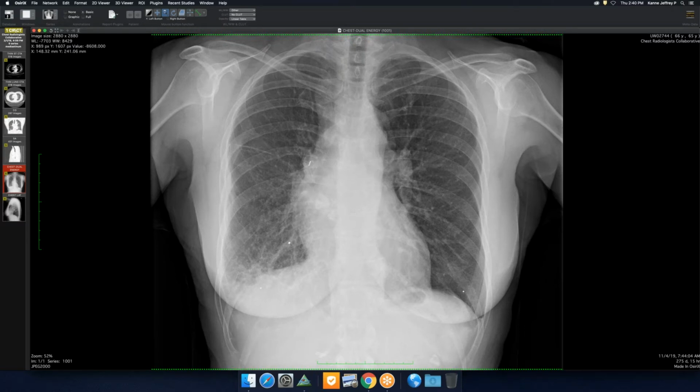So, you think of maybe something congenital. We've shown cases of absent pulmonary arteries, but we can see there are vessels here. They're just very small. You could have an obstructing mass, surgery, or something like that. But this is something we've seen before, but I thought it was a nice case.